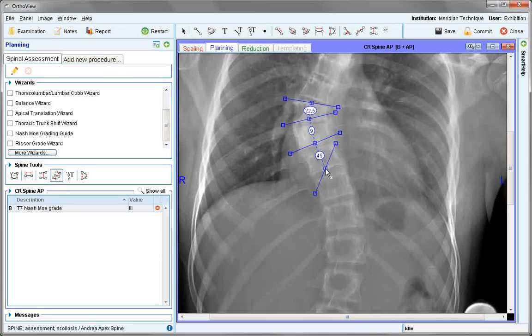Just dragging on down the tool set, and once the final position is achieved, use the escape key or double click on the final handle in order to position and end the tool set. Either adjust the handles to the vertebral bodies if needed, or if representation is good as it is, just leave them as they are. It is possible to go back and remove various points, or in fact add additional ones to the line if needed, and then reposition.